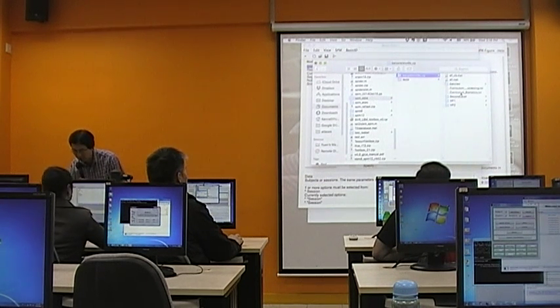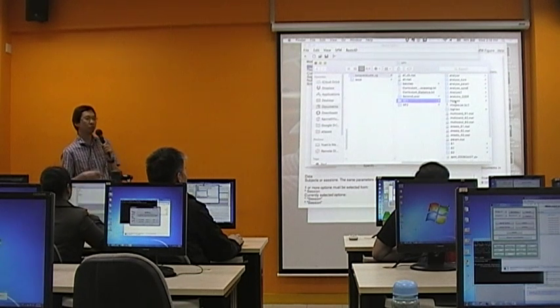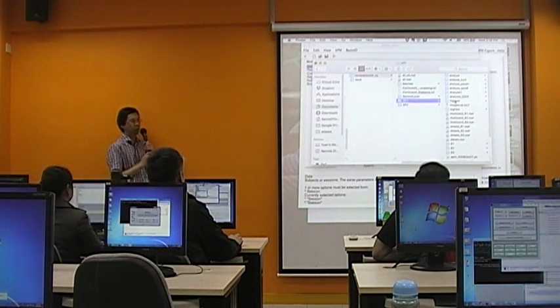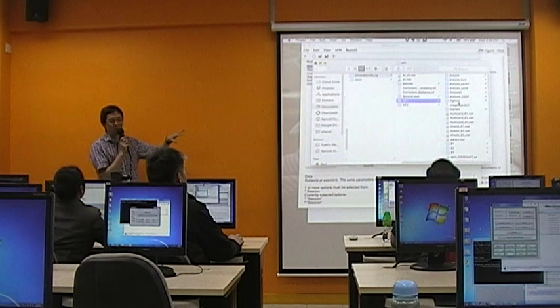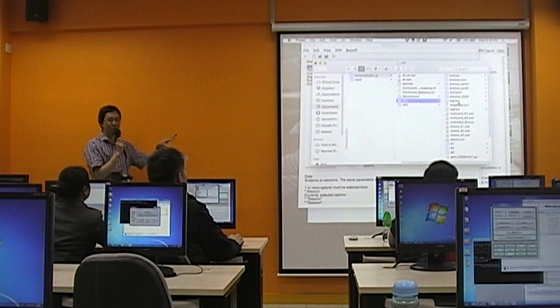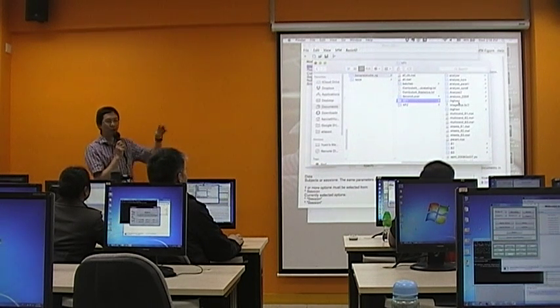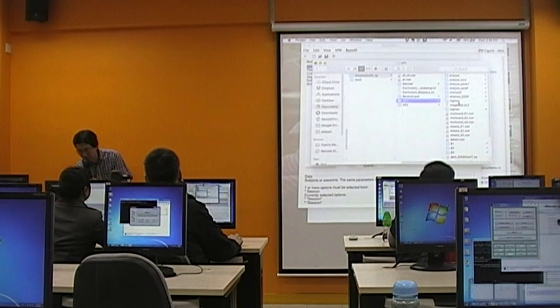You could try to read it if you know German. And then there are two individual subject folders. VP1, VP2 are two example subjects, and within each subject you see all the analyze, and so on. These are the rubbish we haven't thrown away. Because we've used the same data set for demonstration many times, each time we create a new folder within the individual subject. I'm just too lazy to do the cleanup anyway.